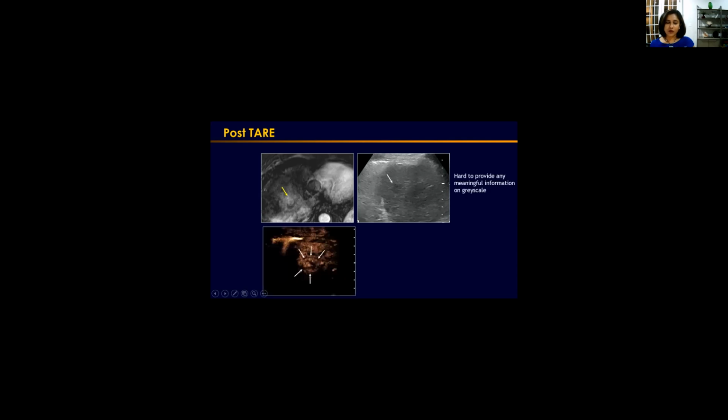After injecting contrast, we see similar findings as on the MRI, where we see a thick rim around the lesion, and this lesion decreased in size over the 1 month interval between these two studies. The lesion further decreased in size, so very similar imaging features as MRI.